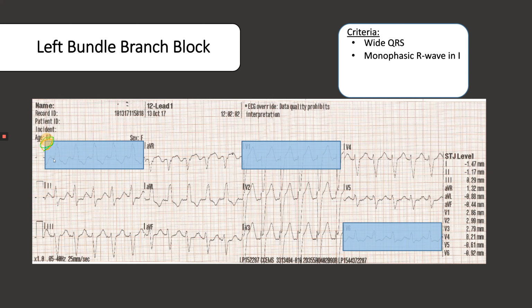So you start with your QRS, draw your isoelectric line kind of all the way through. And what you'll notice is that this is an R wave because I only have an upward deflection, okay? And that upward deflection ends right here. This is where we would count the J point to be.